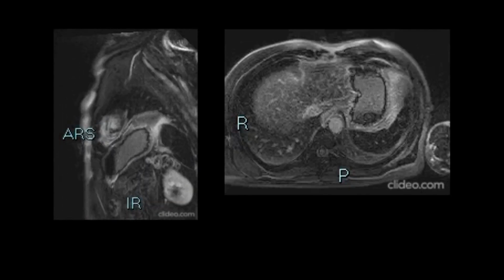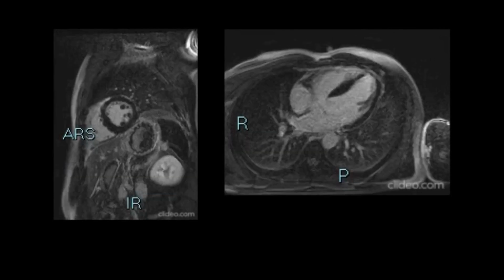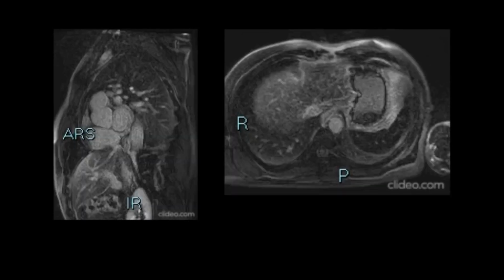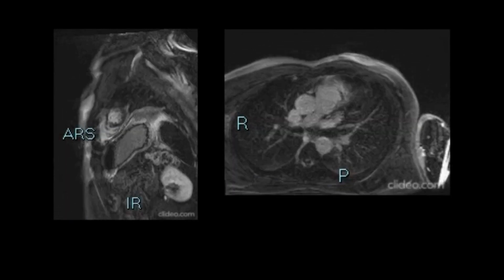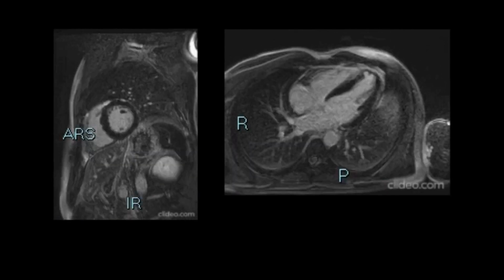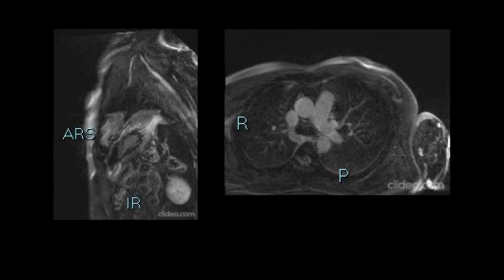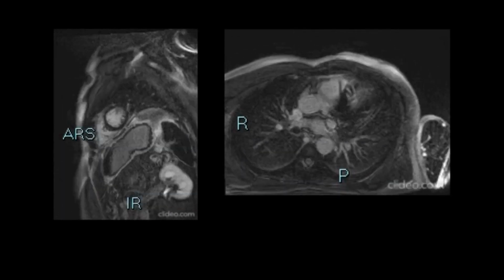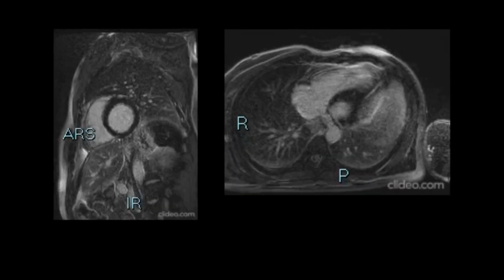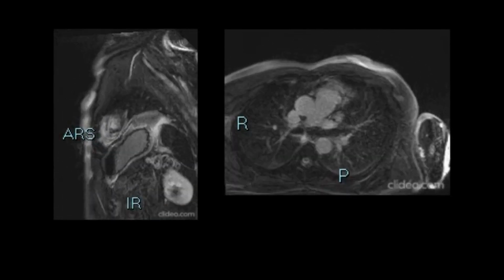Another important characteristic of cardiomyopathy is the presence of late gadolinium enhancement (LGE) that indicates myocardial fibrosis, and this is a typical characteristic of hypertrophic cardiomyopathy. We use inversion recovery fast gradient echo for the LGE assessment, and this technique is an important non-invasive imaging method that can detect the presence and extension of localized myocardial fibrosis. This patient doesn't have any LGE pattern, as we can see from these images.